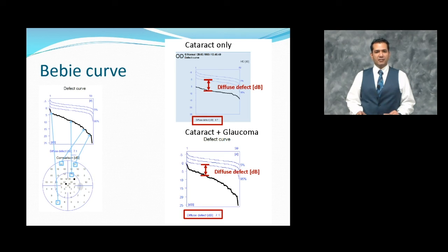Next step is the Bebie curve. The Bebie curve represents the comparison data that is obtained from the visual fields, and they are ranked from the best point to the worst point. And you have a graphical representation that looks something like this. And you have a couple of lines represented just about, if you can see this. If the person is a normal, healthy person, the Bebie curve should fall within the limits of normality. But if there is a diffuse defect, could be due to cataract, then you would see a Bebie curve that is parallel to the normality lines. Or if a person has a cataract and perhaps glaucoma, a region of defect would be diffuse, but then a specific localized defect is also visible.